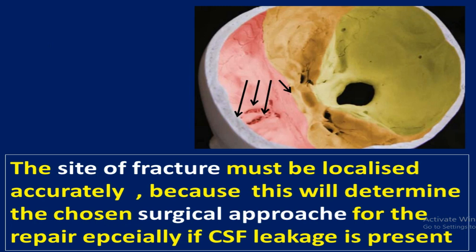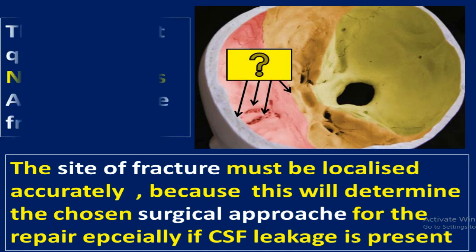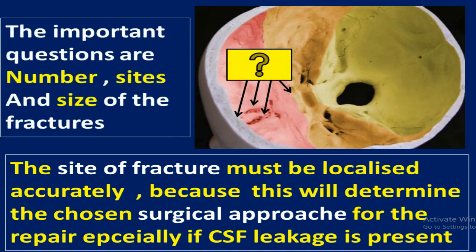The site of fracture must be localized accurately because this will determine the chosen surgical approach for the repair, especially if CSF leakage is present. The important questions are number, sites, and size of the fracture.